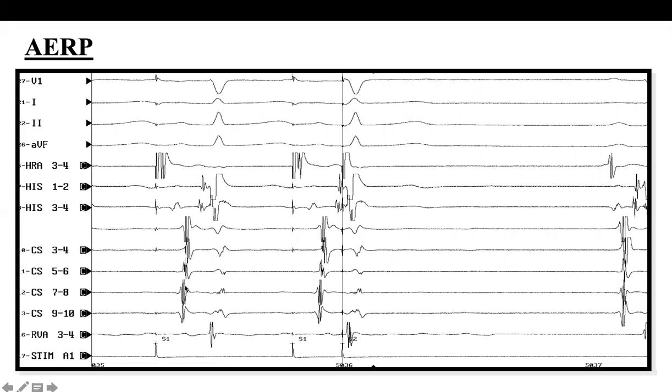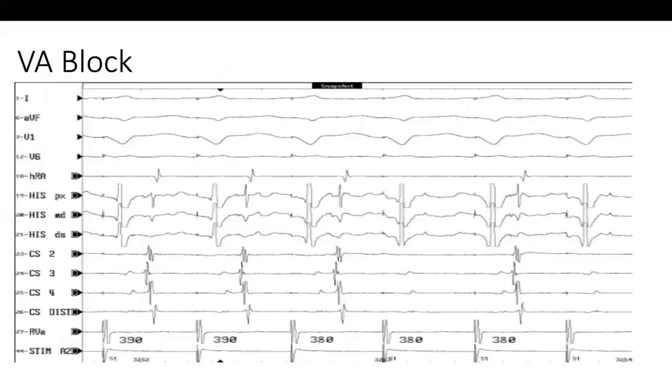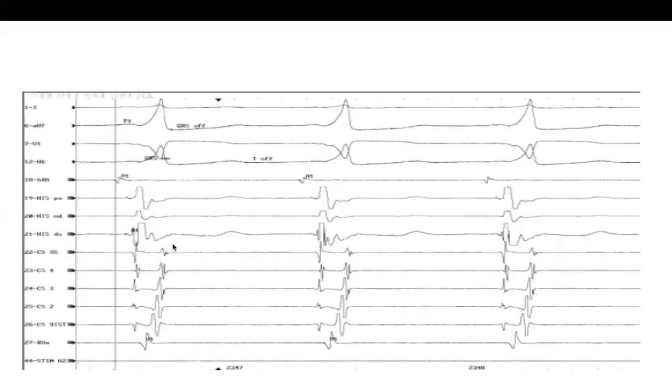Yes. While this one, the ventricular is probably bigger than what we see. This is A and big V. What could be the explanation for that? Accessory pathway? No, it has nothing to do with that. So maybe the site of the catheter.